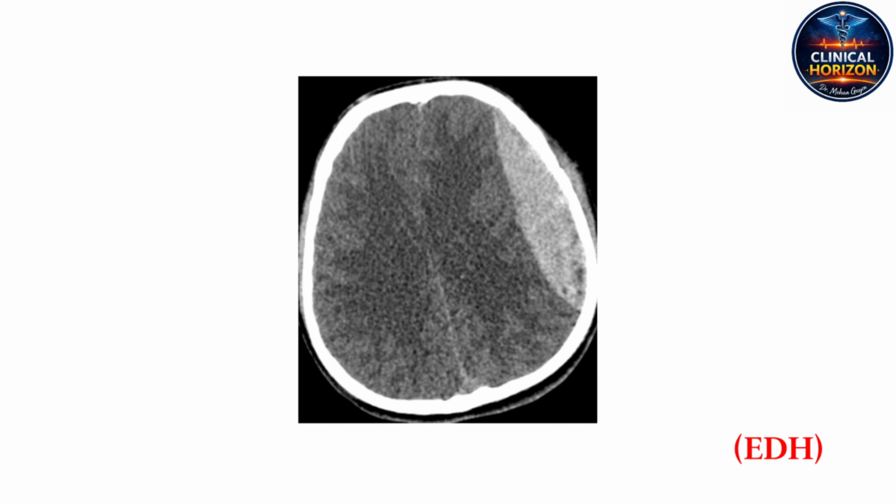An EDH. Yes. The physics of this injury are brutal. It almost always involves blunt trauma to the temporal bone, which fractures and lacerates the underlying middle meningeal artery. An arterial bleed. Because it's arterial, the blood is pumping out under high systemic pressure.